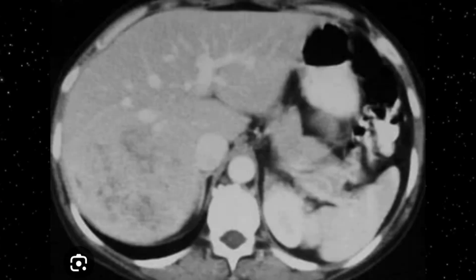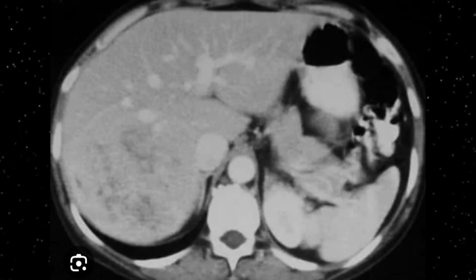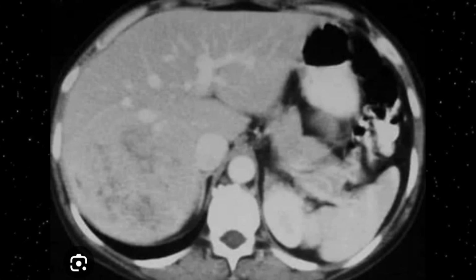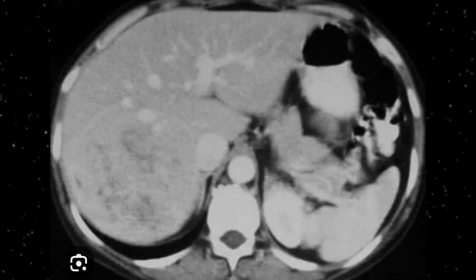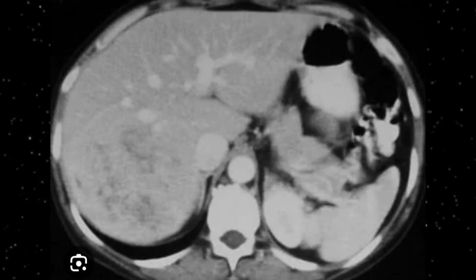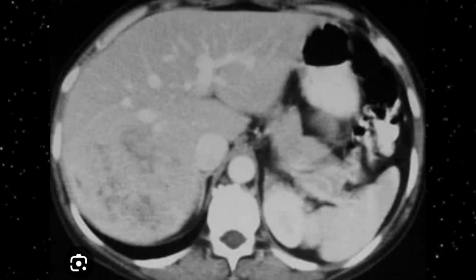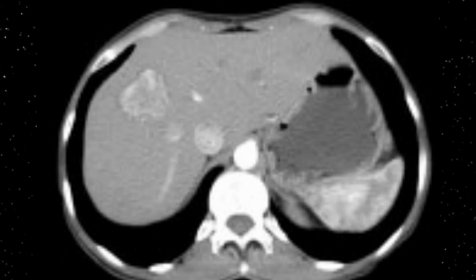Well, another tricky CT scan. Here you can appreciate two small hypodense lesions sitting in the right lobe of the liver. Other vasculature is clearly visible. The liver is otherwise normal. The spleen can also be seen in view, along with other organs and abdominal areas on this axial CT imaging. So these are two small hypodense lesions within the right lobe of the liver. So this is also a hepatic adenoma. A clear picture has been shown on these CT axial images.